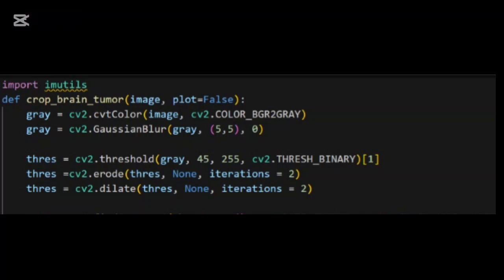In the next function, where we are going to convert the BGR image into the grayscale image, we are using again an OpenCV function, which is a powerful image processing library. So the function is cvtColor, which means we are going to convert the color from a blue, green, red format to a grayscale, which is going to be a black and white format. After this, the gray image will only have brightness values, not colors, and its pixels are going to range from 0 to 255.